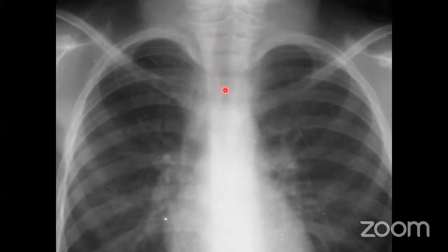The distal part has become narrowed, and there must be something that is compressing it. Paratracheal lymphadenopathy in ALL may sometimes produce a pressure effect over the trachea, and this is called the rat tail sign. These are tracheal stenosis or tracheal compressions. Why am I showing you? Because you cannot miss it. You can tell the physicians that there is something abnormal. You must look into the particular child clinically, and it was revealed it was a case of ALL.